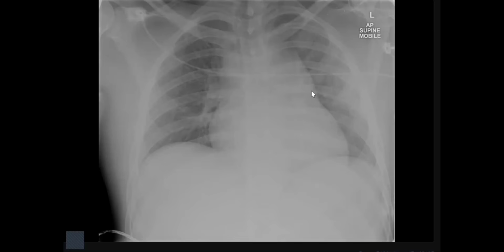Okay, we have here mediastinal widening and some opacity. I can see there is an abnormal vessel widening in the upper part, and also I can see that it is obscuring the descending aortic outline, which is not good, which is obscured by this one.